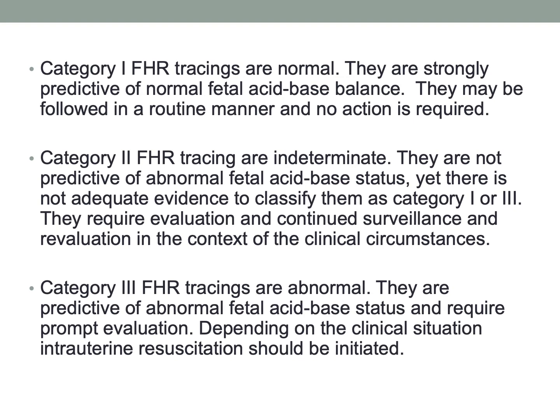You still want to maybe reposition your patient and do something because you don't want a variable. But then you also have category 2s, like the example I just gave, where you have a flat line, let's say baseline 110, but there is absent variability, okay? It's ugly, but because it doesn't have any decelerations, no variable, no lates, it's still only a category 2. Now, we have 2 extremes of category 2. The one that looks beautiful with moderate variability, you know that baby's great, but has 1 variable, category 2. And then you have this baby that has 0 variability, which means there are no reserves, but there are no decelerations, which means it's still a category 2.